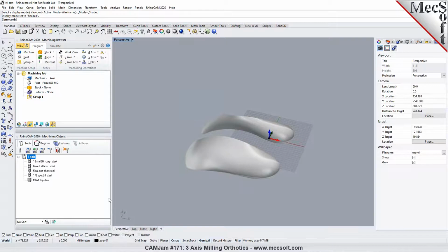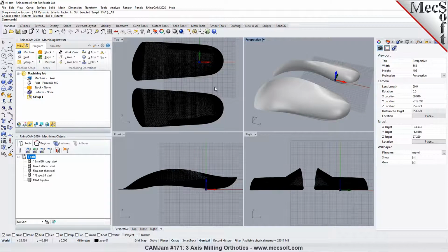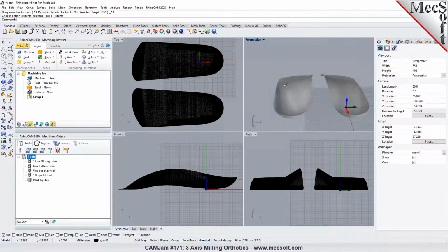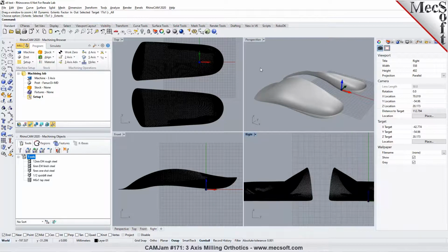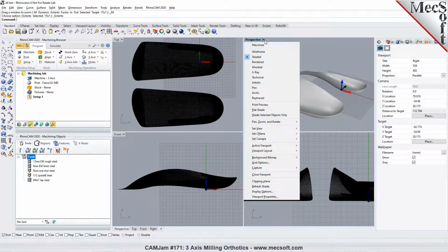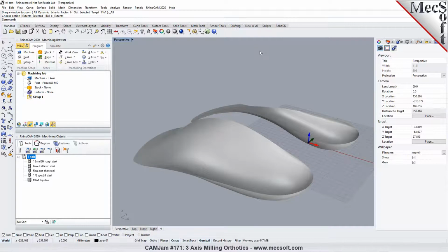And if you take a look at it, you can view it from different views. You can go ahead and click on 4 views. It shows it from looking down from the top. This is a perspective or isometric view. This is from the right front and then from the right side. So you can work in multiple views, or you can just maximize it to a single viewport.